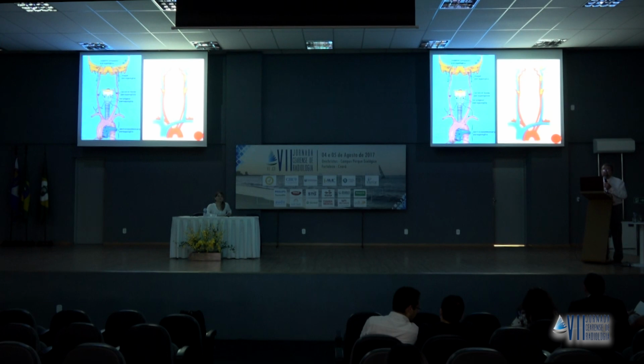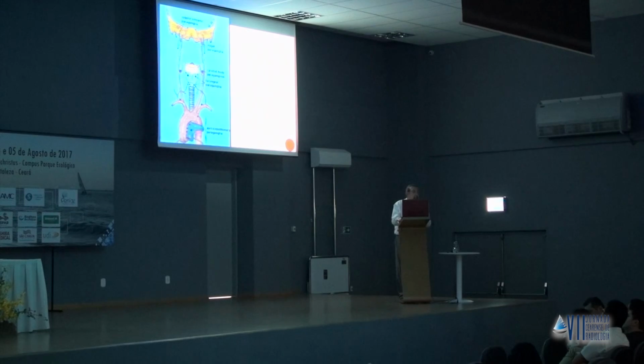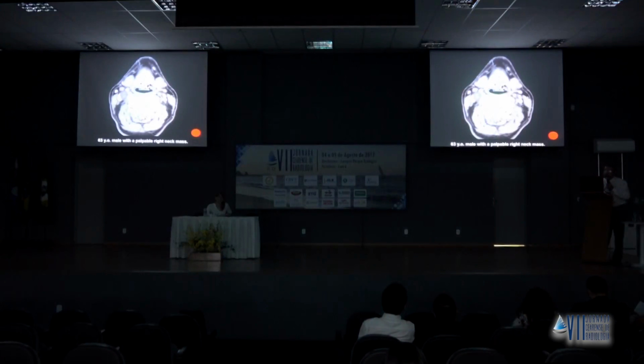They are not exclusive to these three locations that I discussed. We have seen that in the larynx, in the trachea, and in the mediastinum, and obviously in the spinal canal, in the region of the cauda equina. With a hypervascular lesion in that area, one of the differential diagnoses includes paraganglioma. Here is the ascending pharyngeal artery, which is the major supplier for all the other paragangliomas except for the glomus caroticum.